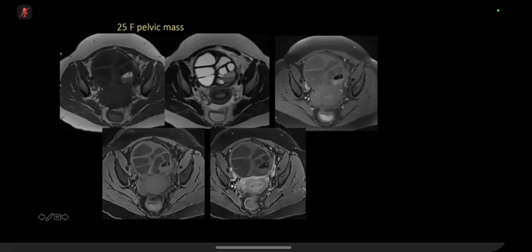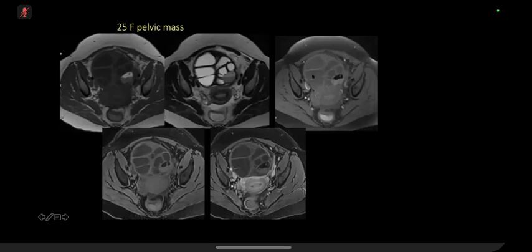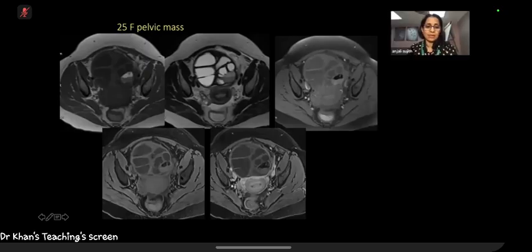Look everywhere else for some clues. There might be some free fluid which is bright, endometrium, urinary bladder, bright T2 follicles. So they're all giving clues as to this is a T2. And this will be a fat suppressed image. And here we have a fat suppressed T1 pre and post contrast.